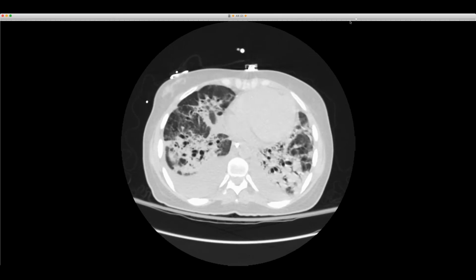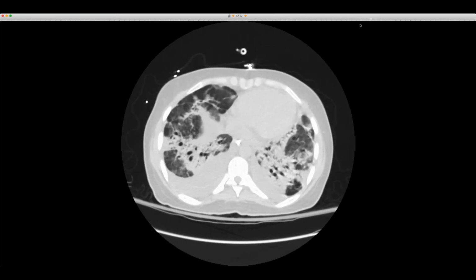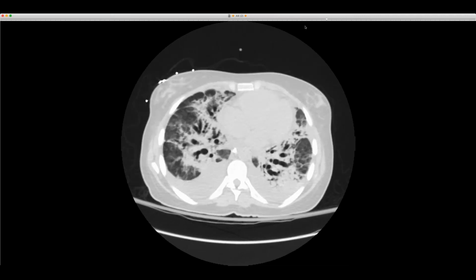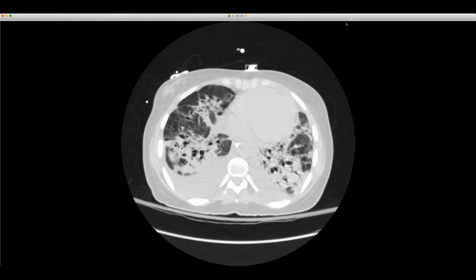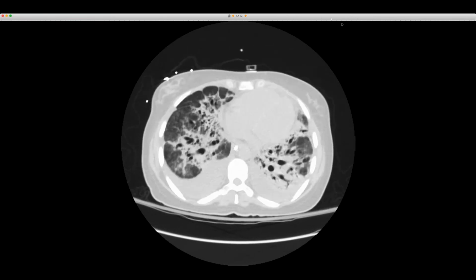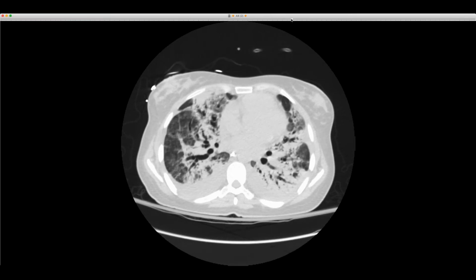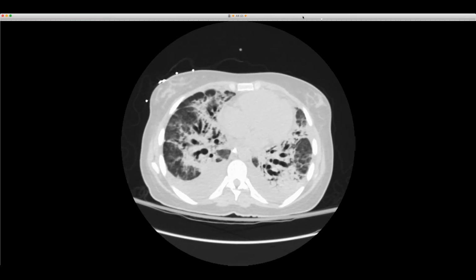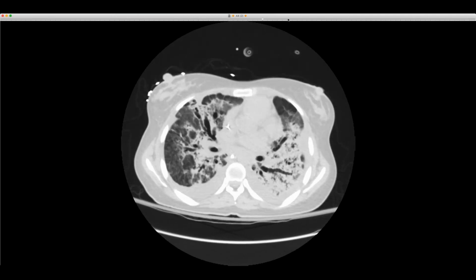So right, but that follows. Yeah, that kind of follows the classic post-ARDS picture, where you have residual anterior scarring but not posterior scarring. You know what I'm saying? I guess maybe it is a little pneumonia, but that's kind of the classic thinking on post-ARDS fibrosis, right? That it's more anterior predominant.